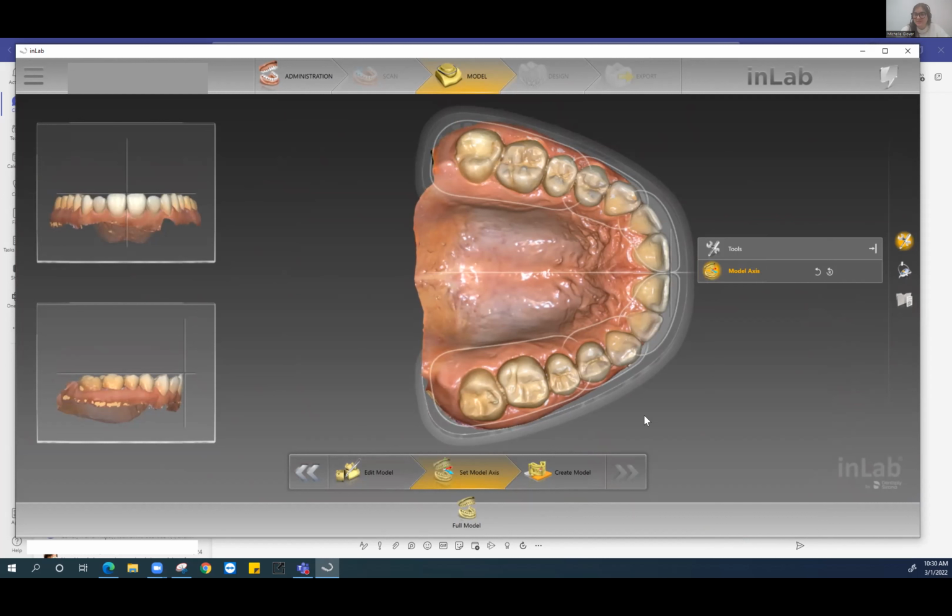I encourage you at this point in the webinar to maybe give me a pause. Just practice what your right cursor does, practice what your left cursor does, practice moving your jaw into position. I recommend trying to get the right-hand side of the screen taken care of first, in terms of your midline, your occlusal plane, and then just overall your arch. And then on the left-hand side, tweak the midline and the occlusal plane accordingly.